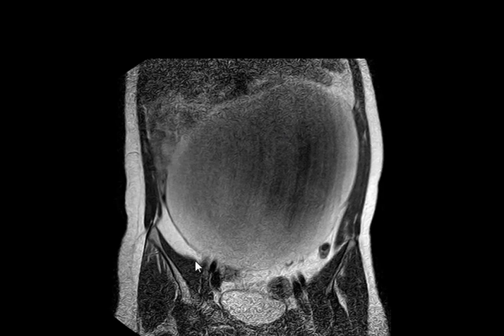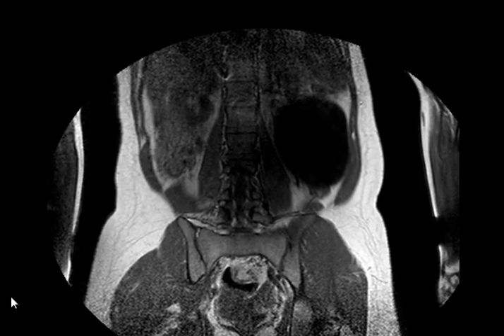I'm thinking of first of all benign lesions like. Wait. Okay. Don't think now. You have a ton of sequences to check. Don't think from the first one. You will be mistaken. See everything you have. Where is the T1? This is the T1.